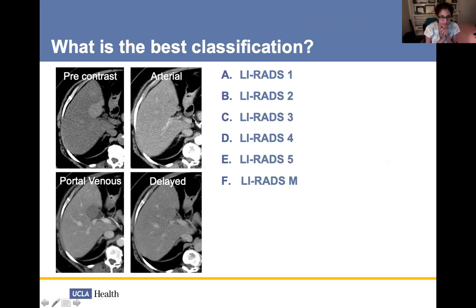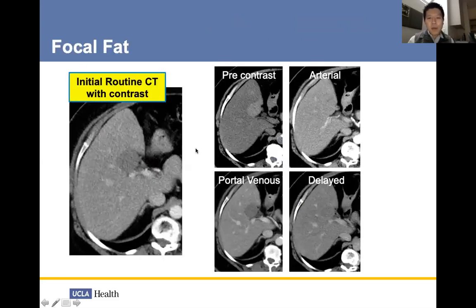So I'm glad I'm showing this. It's kind of curious. It ends up being probably focal fat, but I just don't understand. And I revisited again, pulling up this case. This is indeed denser than the rest of the liver.